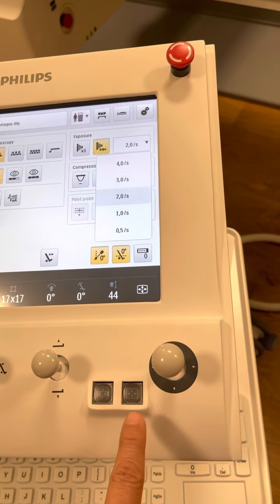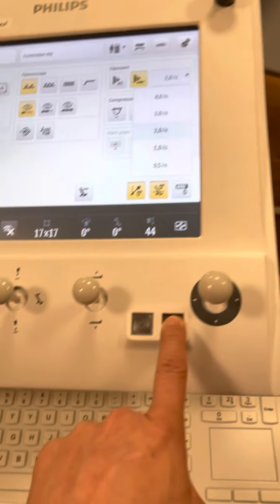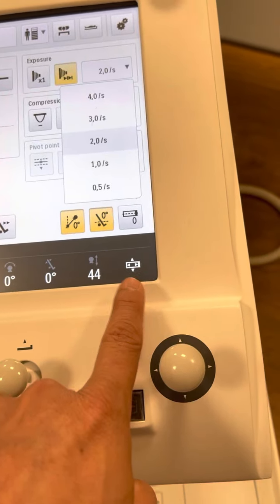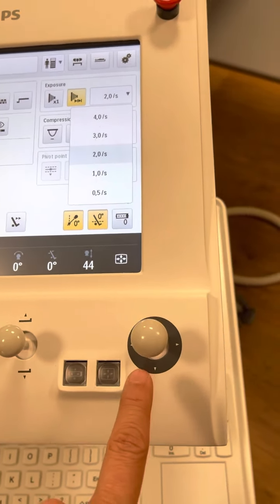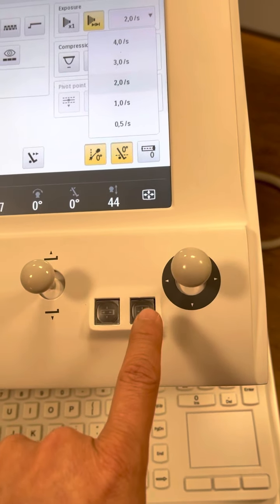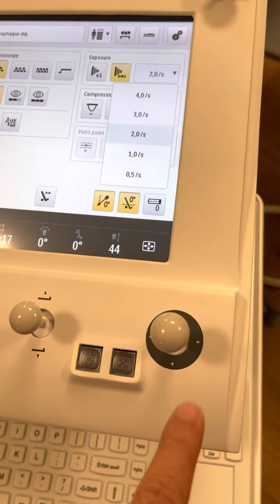So for radiologists, it's better to use this setting, which is this. Technologists had better use that setting. And then when we walk in the room, we had better make sure it's in the radiology setting so that we can move the way we want it.